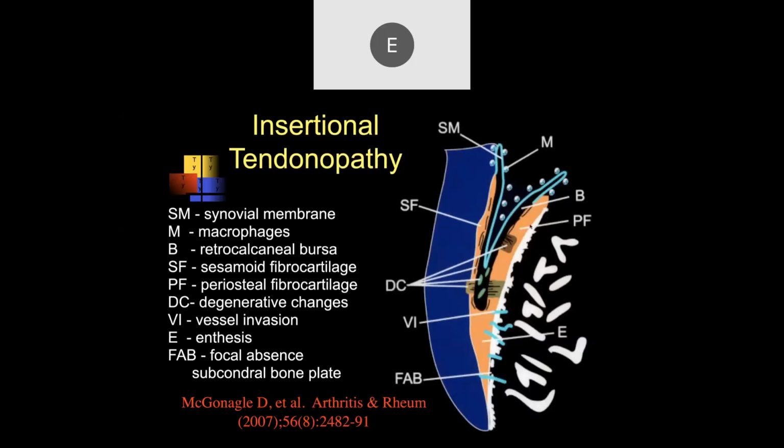This is the trabecular bone and the cortical bone, and wherever a tendon or a ligament may rub against the bone, the body tends to put a synovial sheath in between the two. This is what it looks like at the Achilles, where the tendon comes down and attaches to the calcaneus.